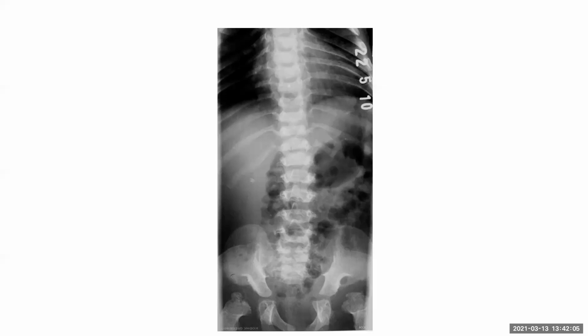Though I'm presented with a limited view of the abdomen and chest, the spine view of the dorsolumbar spine and part of the pelvis, I can see both femoral epiphyses appear fragmented and small. Also, I can see small pubic and small iliac bones. I'm looking for the vertebra.